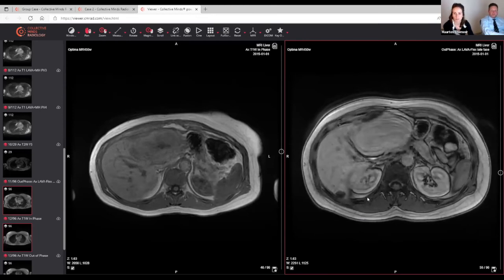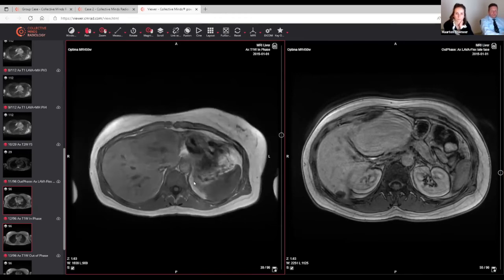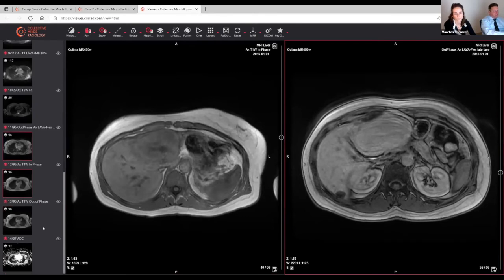So it does not have to be resected or biopsied, but still we did a biopsy, and the reason was because the patient already has an HCC in the large lesion, and there was a nodule in nodule. So we were hesitating whether the small lesion was a steatotic HCC. But normally they are heterogeneous on T2, and they are quite different. But we had to be sure, so we did a biopsy, and indeed it turned out to be a steatotic adenoma and not a steatotic HCC.